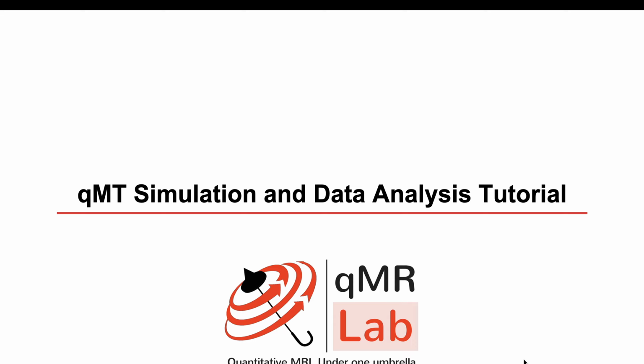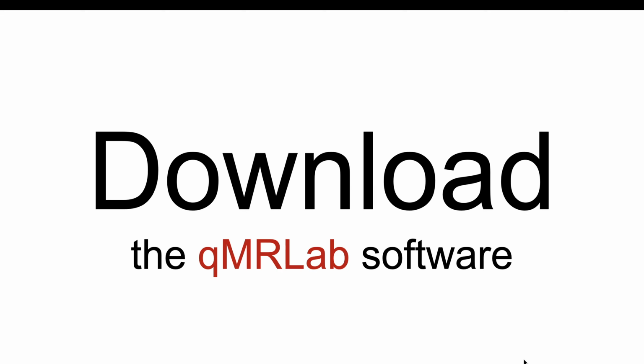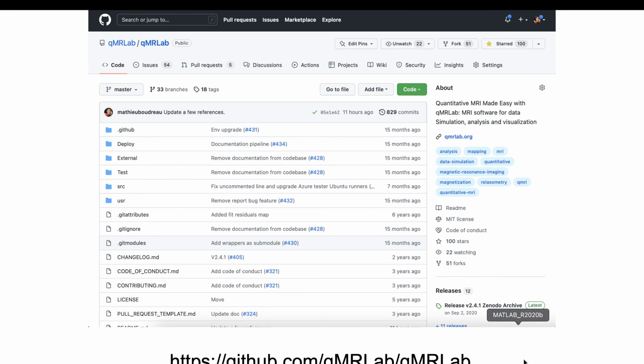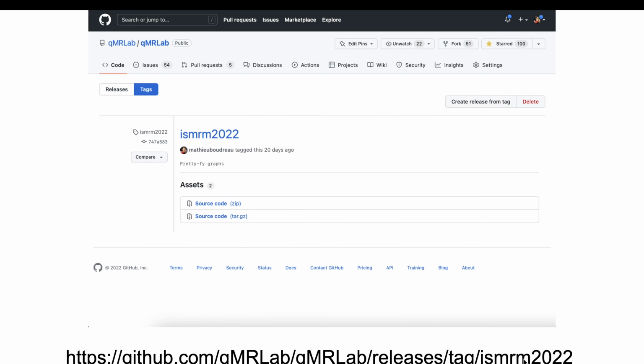So I'll jump into the tutorial. First, you'll want to download the qMRLab software. This can be done a few different ways. You can go on our website, qMRLab.org, and download one of the release versions. You can go on our GitHub page and download the current development version or one of the tagged versions. But if you're following the tutorial at home later on, I'd recommend that you check out the tagged release for ISMRM 22 and just download this version. This will be integrated into the main repository a little bit later on.